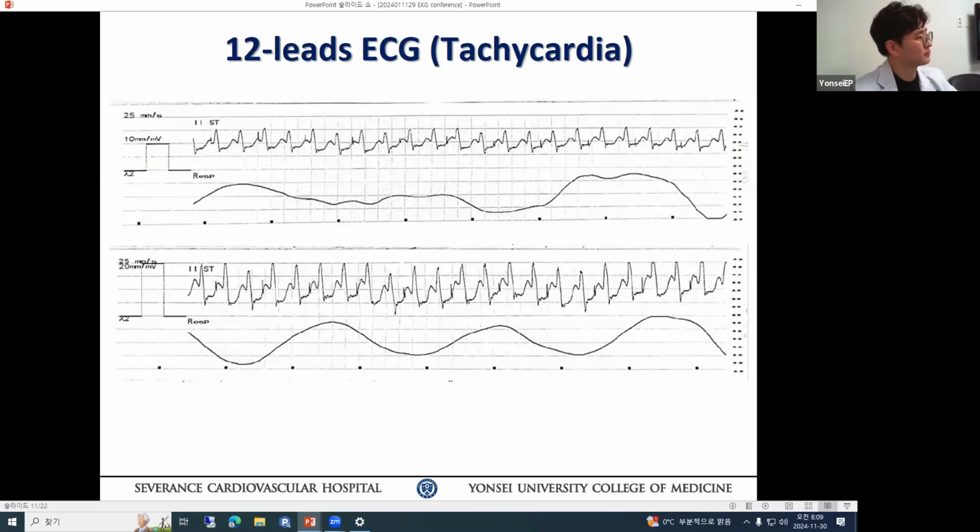Okay, now do you see more clear-cut notching in the QRS complex? Now you see it, that's noisy, right? And now you favor what? Can you still exclude atrial flutter 2 to 1 or not? No. You cannot, because it falls right into the QRS complex. If you measure, right? But if you look carefully at the very last bit of the bottom tracing, that one, we'll go to look at the P wave. Go to the P wave. Yeah, go to that notching in there, right into the QRS. P wave, right? So if you measure that, most likely that's 2 to 1 right there.